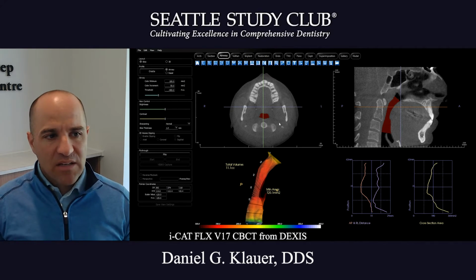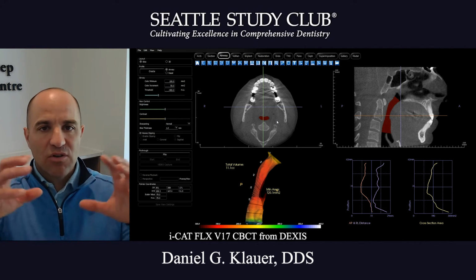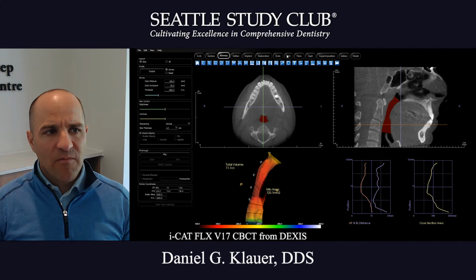But sometimes it is nice to look at the coronal view and see if you see any encroaching of the tonsils in the airway space, or the adenoids or things like that. So we definitely will look at that airway volume render.